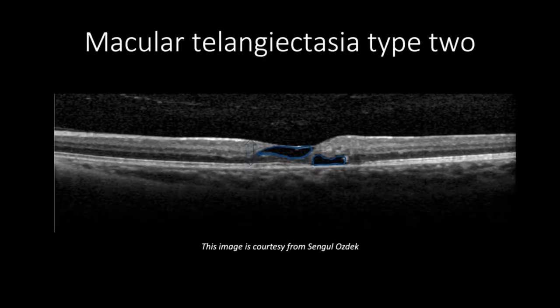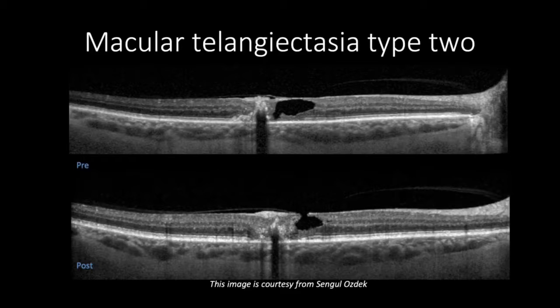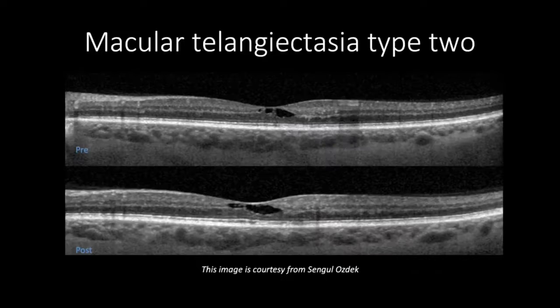Some cases of macular telangiectasia type 2 may get complicated with choroidal neovascularization, which exhibits increased retinal thickening and intraretinal cystic formation and subretinal fluids, along with subretinal hyperreflective masses that may resemble subretinal choroidal neovascular membrane proliferation. Some cases can be combined with subretinal blood or exudation, and some cases can be complicated with a pseudo lamellar hole configuration. OCT is very important to monitor and follow up macular changes in macular telangiectasia type 2.